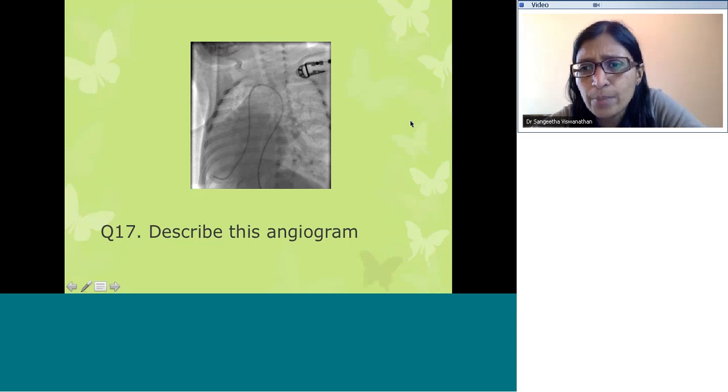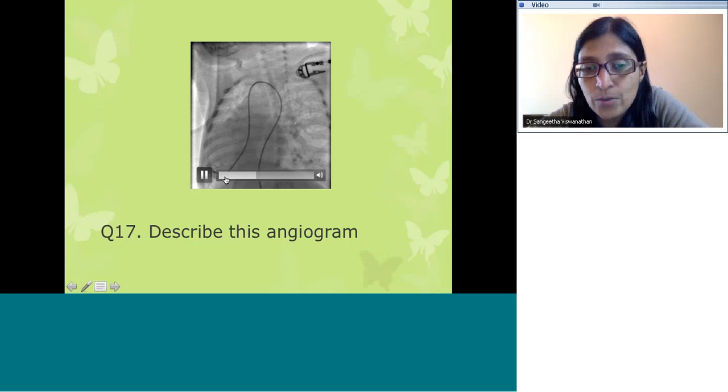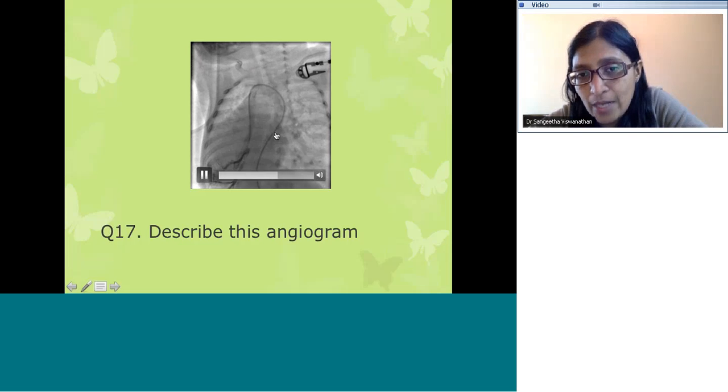What is this? Aorta, PDA, PA, and all that. So this is a pulmonary vein that you've cannulated. This is on the right side, the lower pulmonary vein has been entered, and it is draining anomalously. So IVC into the atrium, into the SVC, and into the pulmonary vein.